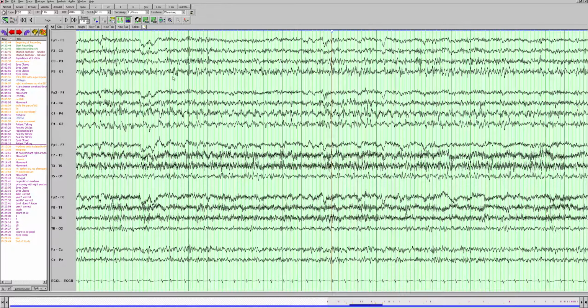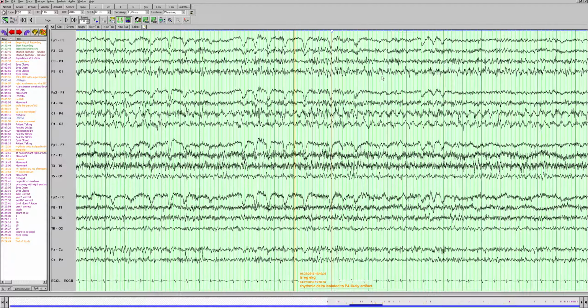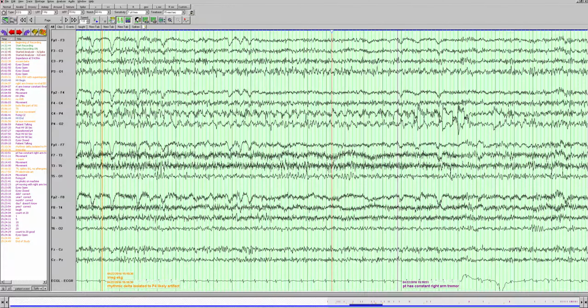It looks like there is a little bit of asymmetry here in this region. Some waves here that we're not really seeing on the left side in the left parieto-occipital region, so we'll just keep an eye on that area. And it's becoming a little bit more obvious here. So this looks like delta activity. It's somewhat rhythmical. Now, it's definitely asymmetric between the other side.